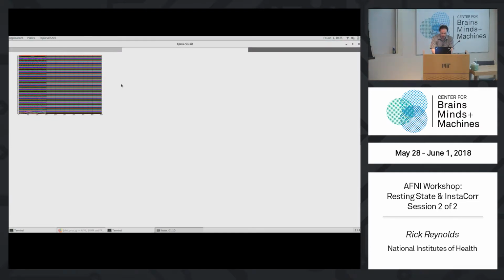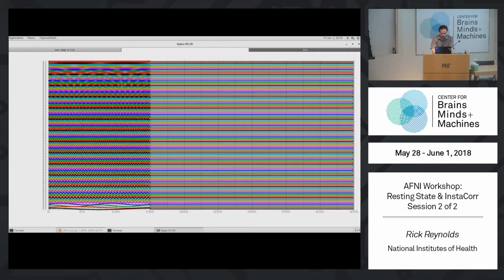We can't even really see this, can we? Let's see. So you can kind of see it there a bit. But what are we looking at? You see the sinusoids on the left. You see the 0.01, which is our high pass. Those are the slow frequencies. We're going to regress out things slower than them. So we have a few high pass terms with low frequencies on the bottom. But then we have all our high frequency terms on the top. And they're just the sinusoid pairs, sines and cosines at all of the frequencies that we want to project out.